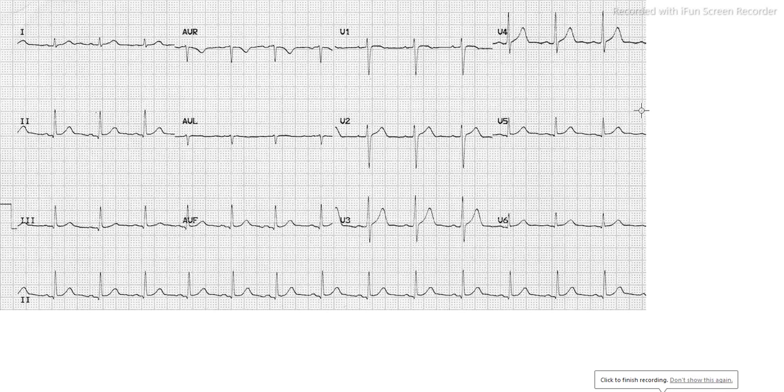In this video, we'll be talking about the basic fundamentals of reading an ECG, that is, to determine the rate, rhythm, axis, and to say whether it is sinus rhythm or not. To tell whether an ECG is sinus rhythm or not, there are certain criteria to be fulfilled.